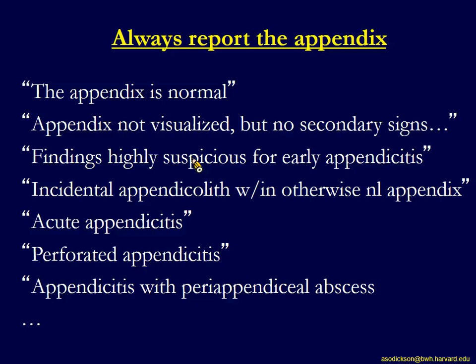I think we're very bad at this diagnosis. But you can see some patients who have persistent wall thickening and very subtle inflammatory changes that could represent chronic appendicitis. I at least am not very good at distinguishing that from early, subtle, uncomplicated appendicitis. I'm not sure it matters. I think those patients should have their appendix removed.